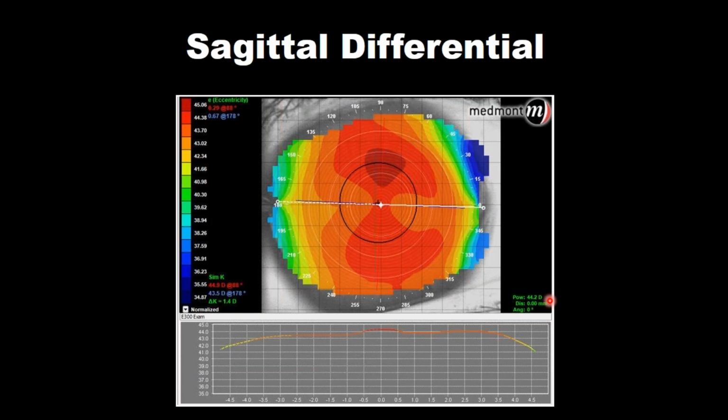So one of the first things that I do when we look at a potential patient for CRT lenses would be to, number one, check the corneal astigmatism. So what's the central corneal cylinder? Then the second thing that I would look at is on the axial map, is it apical or is it limbus to limbus like you see here?